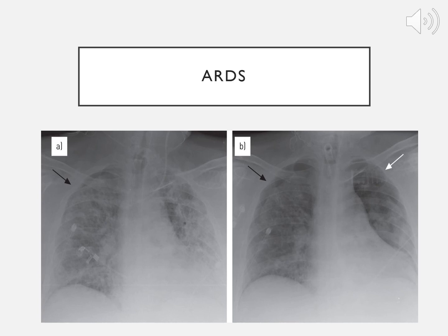These patients aren't going to respond to Lasix, because it's not from heart failure. It's from something else. You give somebody Lasix, you treat their CHF, their pulmonary congestion will heal up or disappear in a few days. Patients with ARDS, these X-ray findings will last for weeks, and we'll have some lifelong residual findings as well, generally.